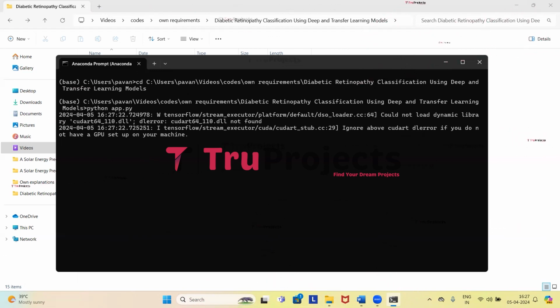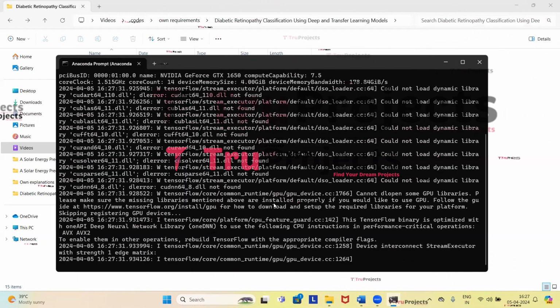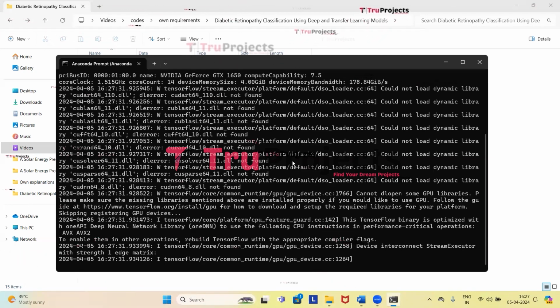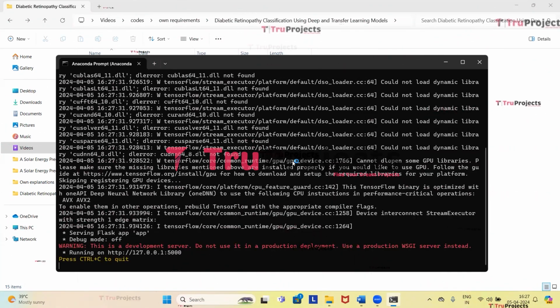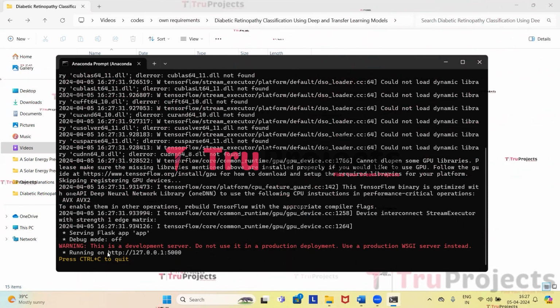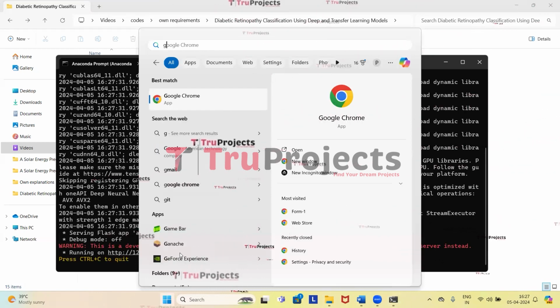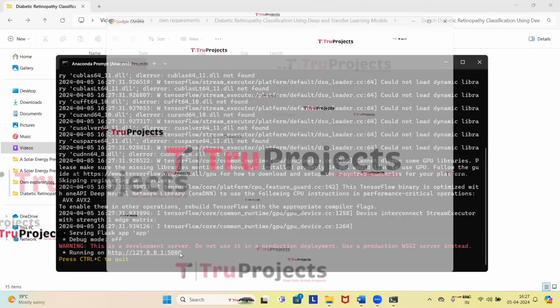This command will execute the Python script and perform a runtime check for syntax errors in the project. After running the python app.py file, the Flask framework runs the application locally at the default address, which is localhost, and the port, unless configured differently. So this is the localhost and this is the port. Now we need to copy this local link provided by the framework and paste it in any web browser. So I'm copying the link. Now we need to open the web browser. I prefer Google Chrome, so I'll paste it in that.